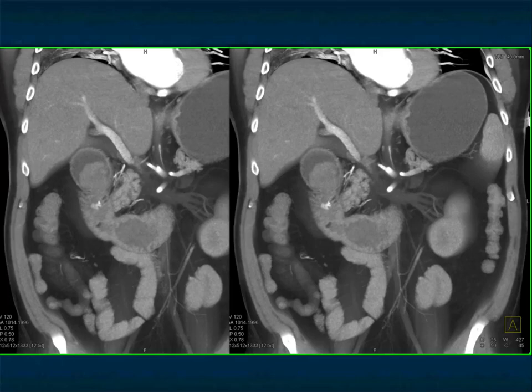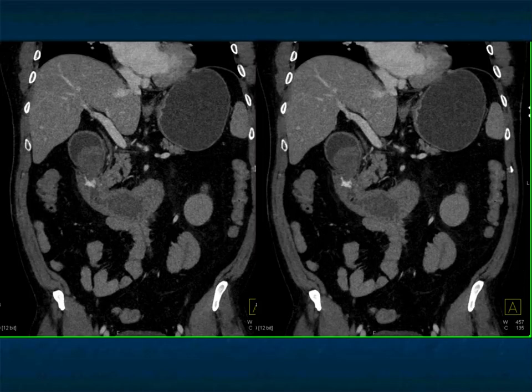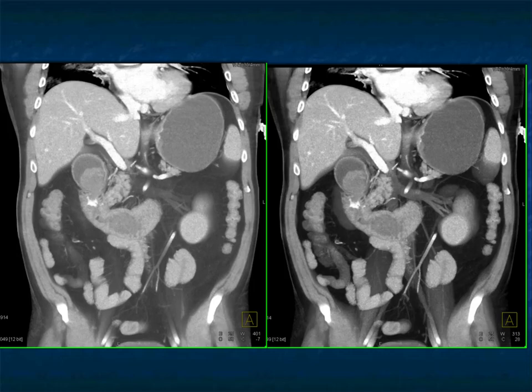Again, you want to look very carefully for the presence of blood, be it small bowel, colon, or stomach. You also want to be very careful not to overcall it, but when you have an appearance like this, it's suggestive, and then you see the active site. It's very easy. Here it is, just straightforward coronal views, very nicely shown. So again, the importance of looking carefully.